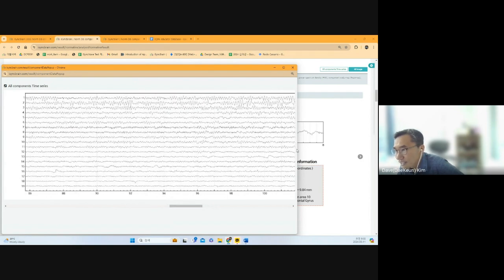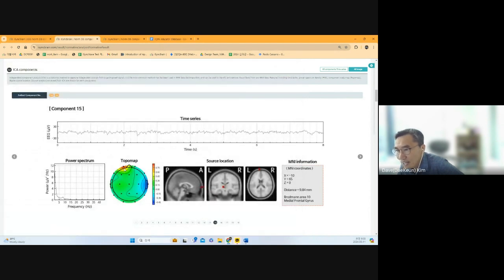So it is rejected by AI as an eye blinking artifact, but T4 is not that artifact area; it combines the eye blinking activity and a mixture of two different kinds of oscillation. But due to the eye blinking, it is rejected.